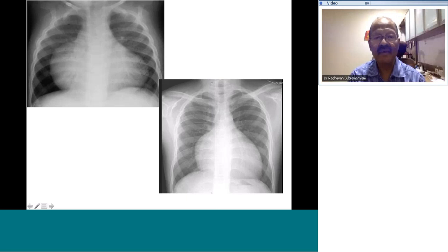Okay, let me take over. Yes, everybody says cardiomegaly, that's very clear. Cardiothoracic ratio approaching 75%, there is no doubt about it. It's not left ventricular enlargement, it's a typical rounded apex lifted off from the diaphragm. If at all anything is there, it's actually right ventricular enlargement. The right ventricular outflow is actually concave, it's not prominent. The main pulmonary artery is not prominent.